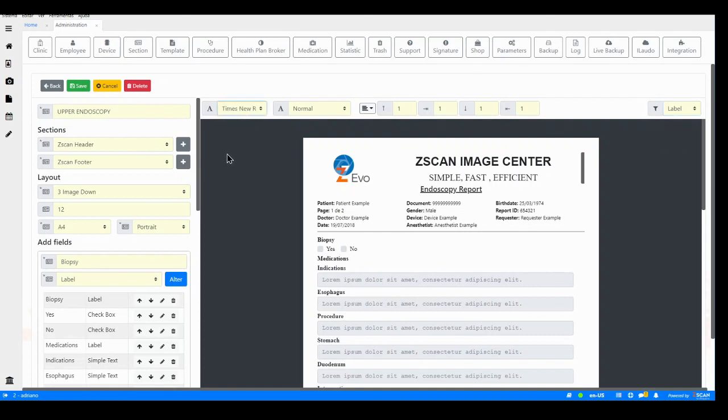And if I want to change the field's font type, I can go there and change to field, and the changes will be applied to fields. So very easy to set different font types for your report template.